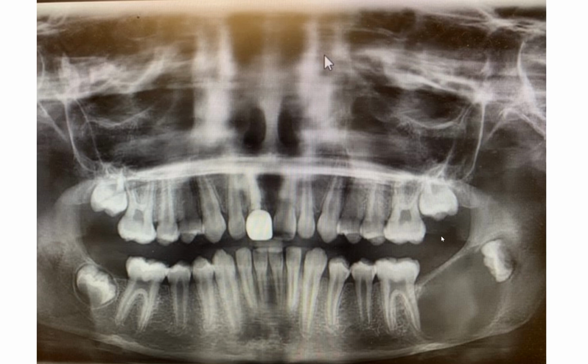I think a couple of things that we can learn from here. Yes, OKC can occur at a very early age, as it did in this case. Not only that, you can learn the expansion or the growth of the lesion over the period of 2 years. So that growth and expansion rate is not going to be the same from patient to patient, but I think at least from this case we have some idea of how fast or slow it's going to grow.